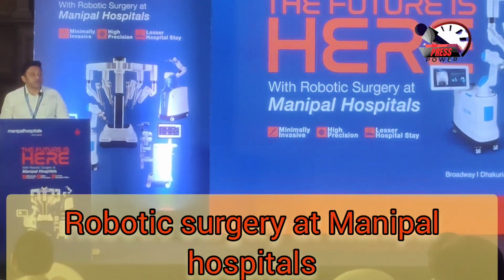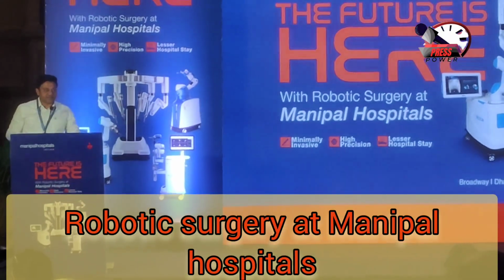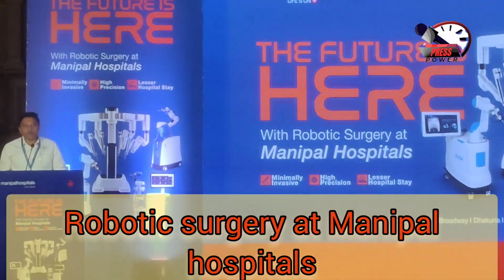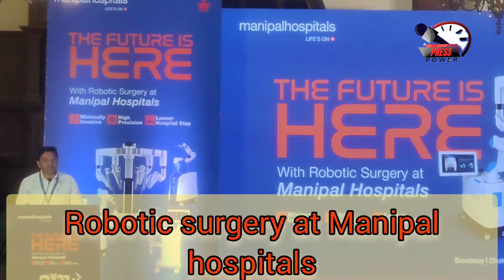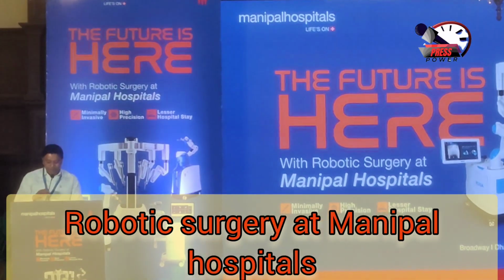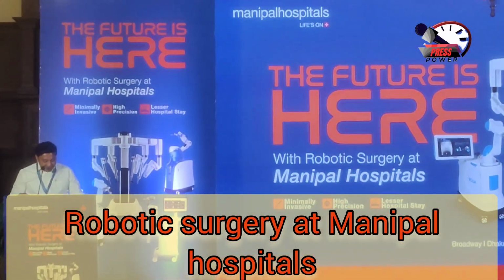So, I will disagree with what Dr. Shaurav said, that robotic surgery is the future. Robotic surgery is not the future, it's already present. For gynecology, the surgical robot got FDA approval, the US authority approval, in 2005. There have been 20 years of gynae robotic surgery. So robotic surgery is not the future, it's already present.